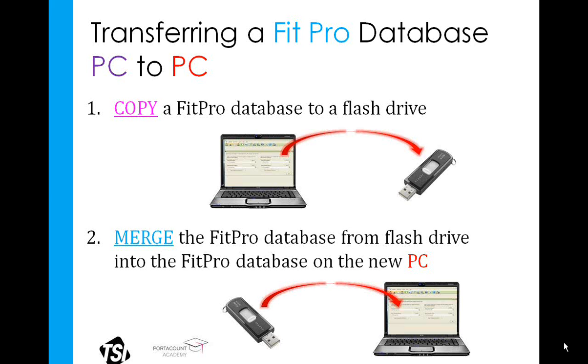Then you could take and merge that data back into the FitPro software on the other computer. So you take that flash drive, go to the other computer, and merge that data onto that FitPro database. Okay, it's just a good example of some of the variety of functions that this software can do, and all of these steps can take place within the FitPro software.